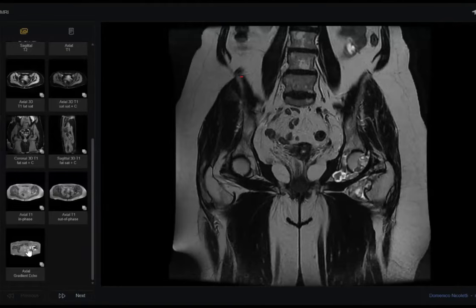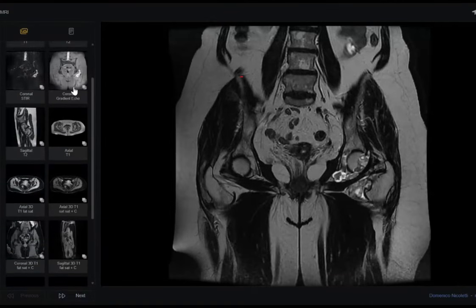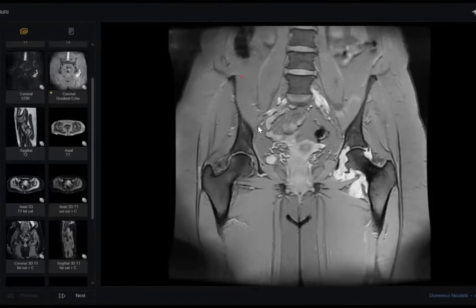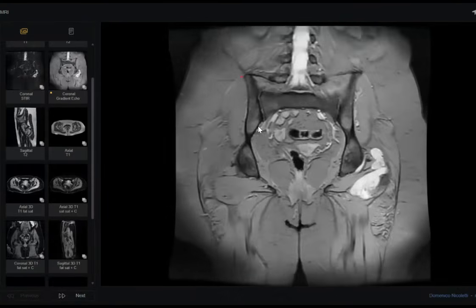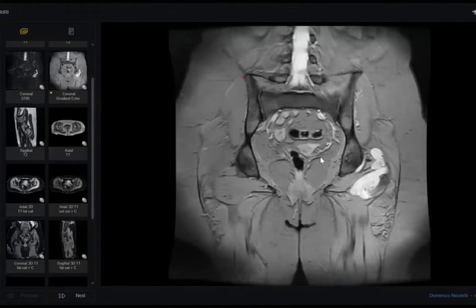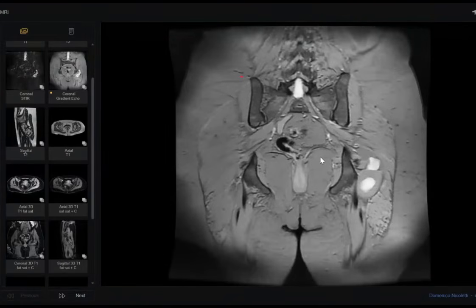On X-ray it is very confusing because the appearance looks like synovial hyperproliferation. So you are thinking of a synovial mass without those bodies. When you asked about the gradient, there is no signal loss, so this is not pigmented villonodular synovitis.